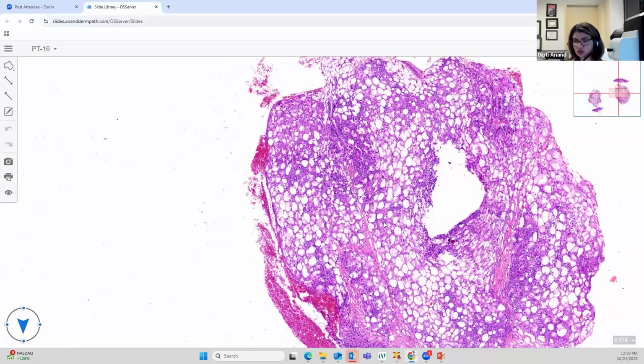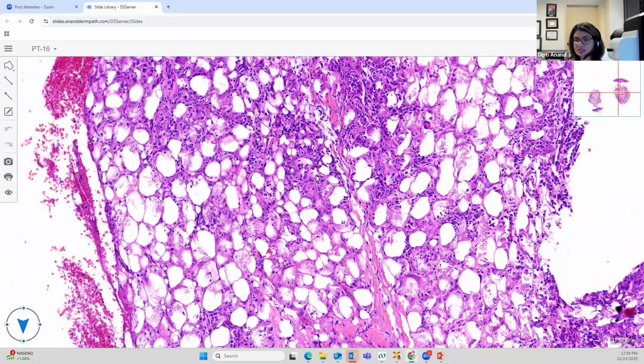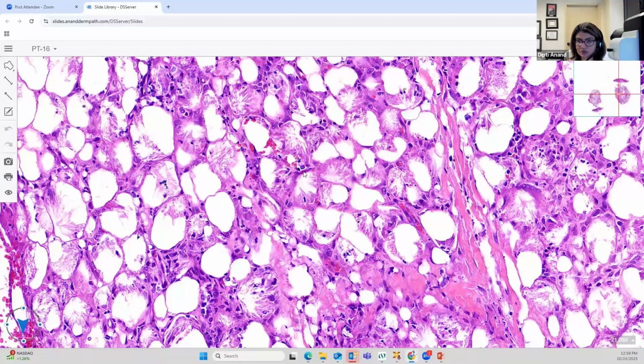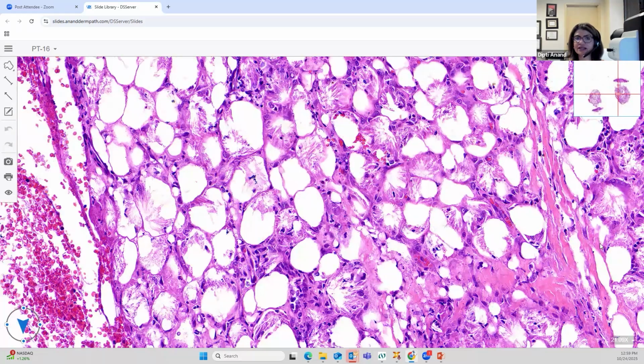And the classic pattern of lobular panniculitis is these precipitated triglyceride needle-shaped crystals. So you can see these precipitated triglyceride crystals in the lobules of the fat. That defines subcutaneous fat necrosis of the newborn. They love to ask you about the secondary metabolic abnormalities in this, so you should know about that, the hypercalcemia and the hyperlipidemia. Thrombocytopenia as well.